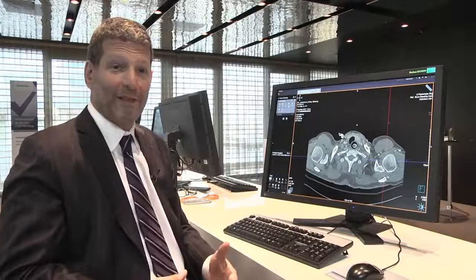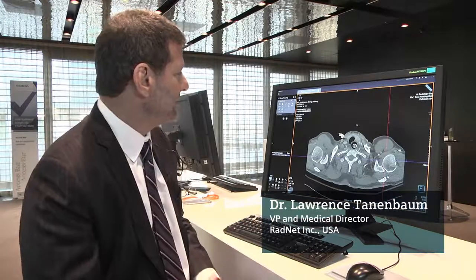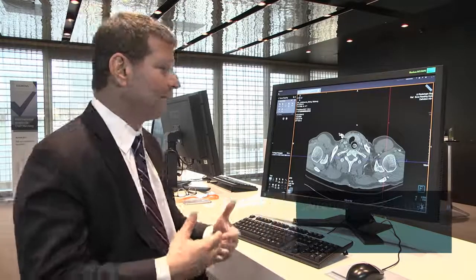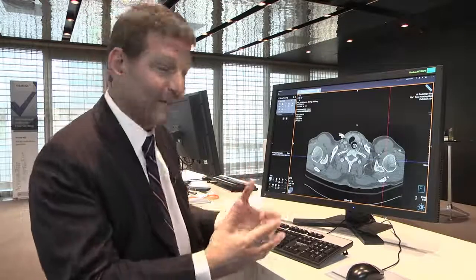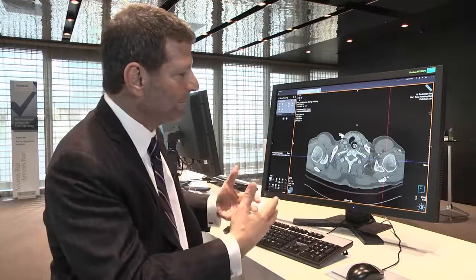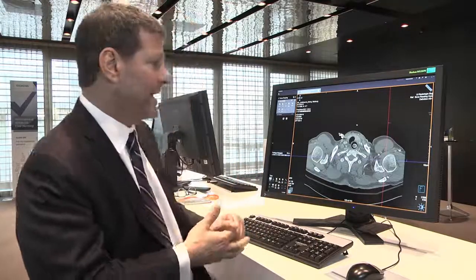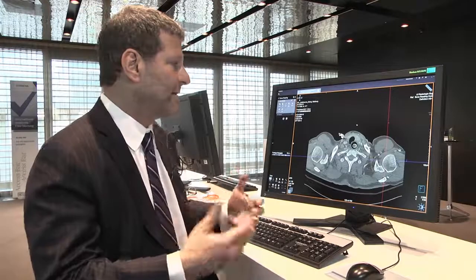I'd like to take this opportunity to share with you one of my favorite VIA applications. This unfortunate patient was in a skiing accident in Salzburg, it seems, and this is a borrowed case. I run my own ski meetings in Vail and Aspen, and we don't have these kinds of injuries, where the snow is nicer, but I'd like to share with you how this VIA application, this bone reading application, changes the way I interact and interpret data.